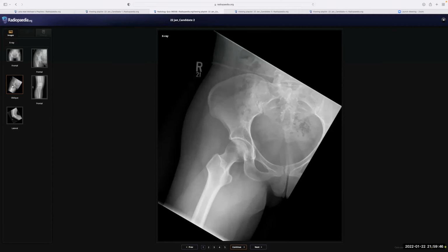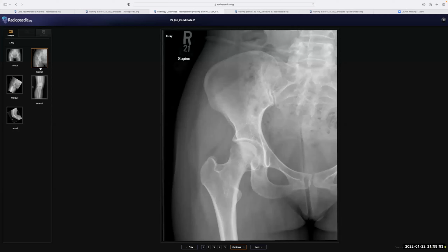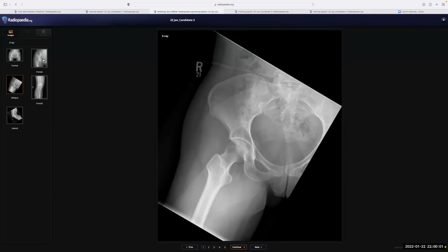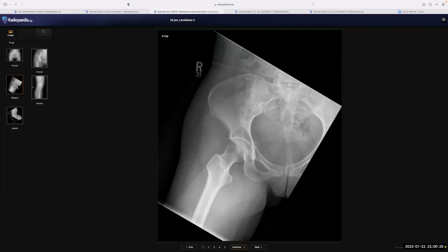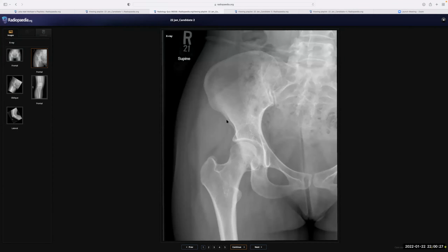I'll have a look at the close-up views as well. So this patient is with right lower limb pain. I felt that there is a lucency here in the inferior part of the right femoral head, but when I look at the oblique view, the femoral head looks fine. But this area, ill-defined, does not appear normal to me. I'm trying to see if this is some sort of avulsion fracture, but usually the sites are anterior superior, anterior inferior, ischial. So this does not fit into any avulsion fracture either, but this definitely seems to be abnormal.